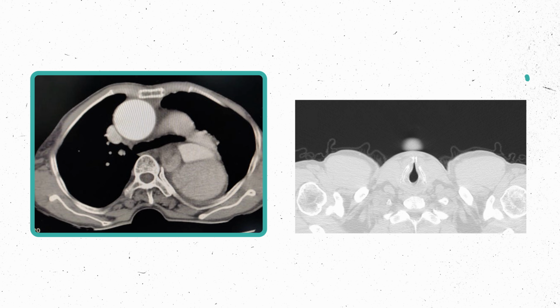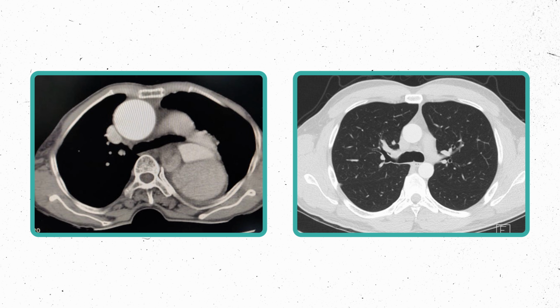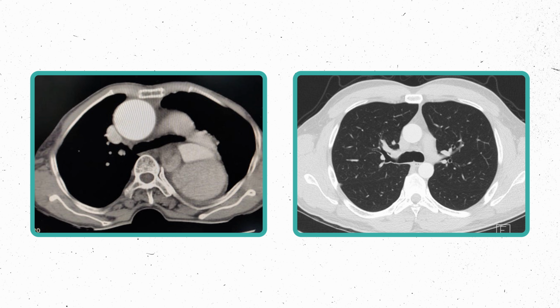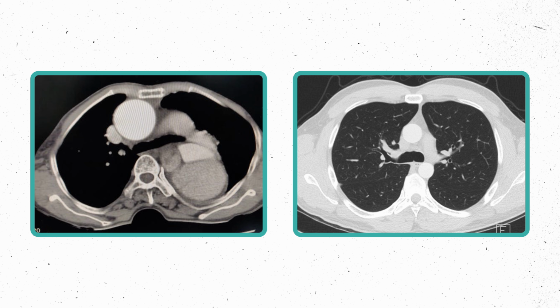For comparison, here's a normal CT. Take a second and see if you can figure out the diagnosis. Now, don't blame yourself if you find this image a little disorienting. That's because of the unusual diagnosis.